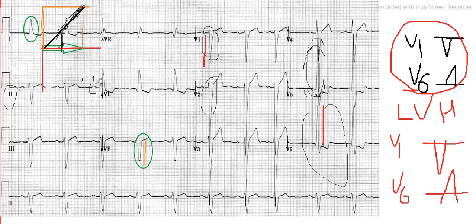And a quick assessment of finding the rate. Okay, from here I am taking the greater square box, it is 300, and till here it becomes 150, till here it becomes 100, until here it becomes 75.